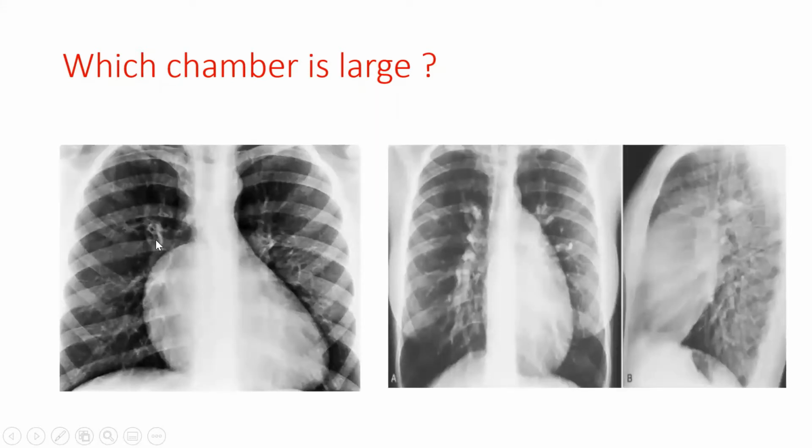And which chamber is large here? This one here. Right atrium, very good. So the right atrium is dilated, and which other chamber is dilated?